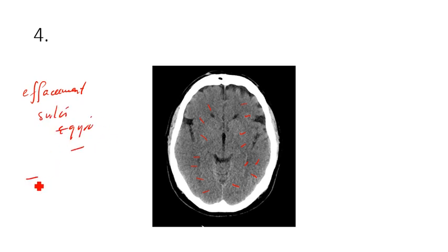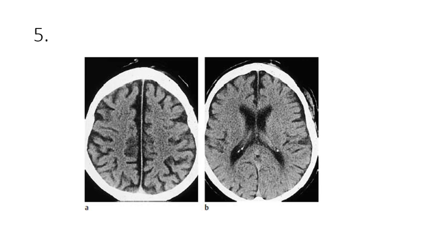Okay, and so that, ladies and gentlemen, is what we call cerebral edema, which means the brain is swollen. So it's filling up all those spaces because it's swollen. That's why you're not seeing the normal sulci and gyri. So this is generalized cerebral edema, and it has to be managed.